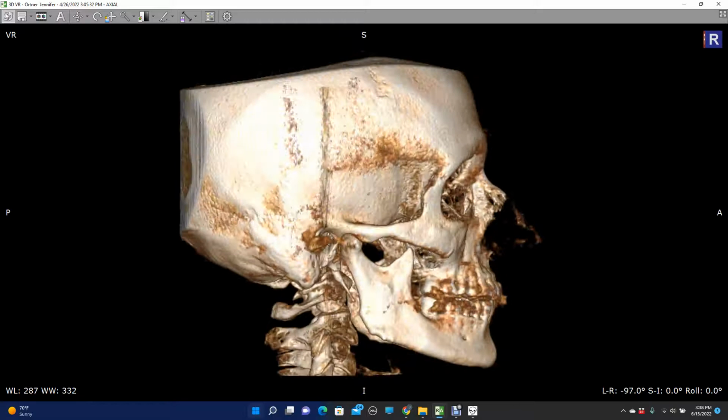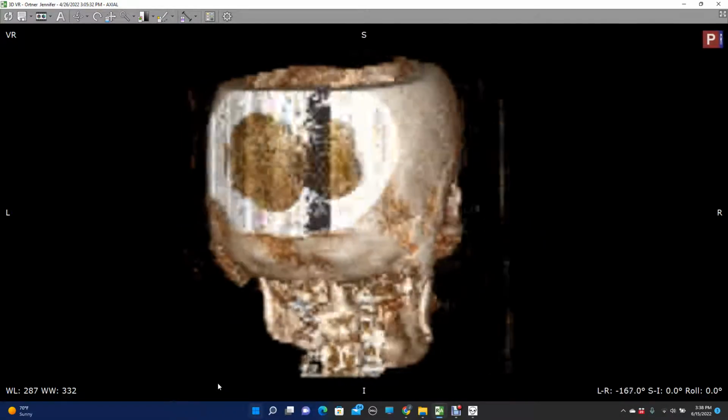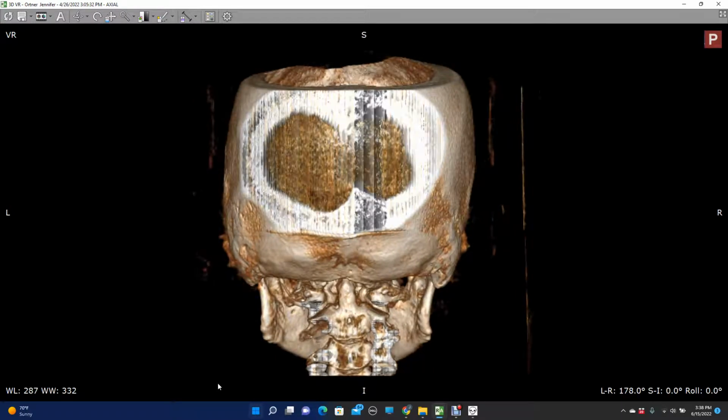We will definitely be changing the analysis as we learn more, but I created a need for the upper cervical doctor to just try and get a quicker measurement system here. And this has been working really, really well for me.